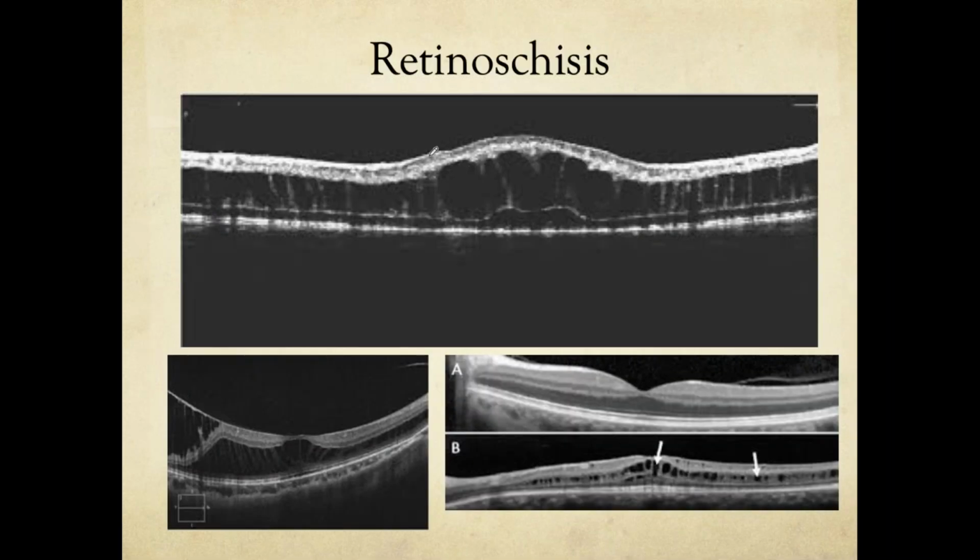So this is a retinoschisis, as I mentioned earlier. It's now easier for you to understand. This is a normal retina. If the detachment and the splitting is occurring, but it's not occurring here, it's just occurring in the same plane. These are retinoschisis. Very, very poor prognosis. These people will ultimately have a complete scotoma, and they will become like PL patients. So this has a very, very poor prognosis.